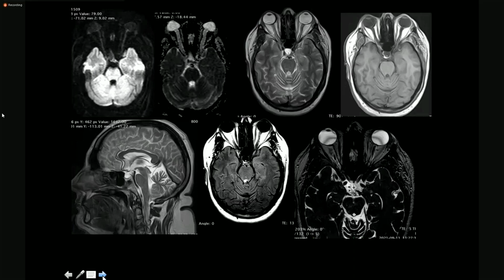Okay. Ma'am, there are no abnormal signals in the brain parenchyma. The flow voids of the sinuses appear intact. And so up till now, you have picked up one finding, that there is fluid signal intensity in the region of sella. Right? Yes. And so what is that? That is an empty sella.